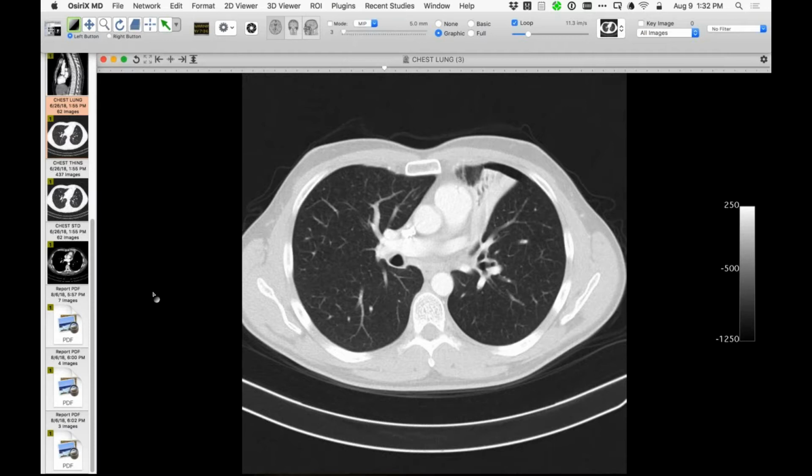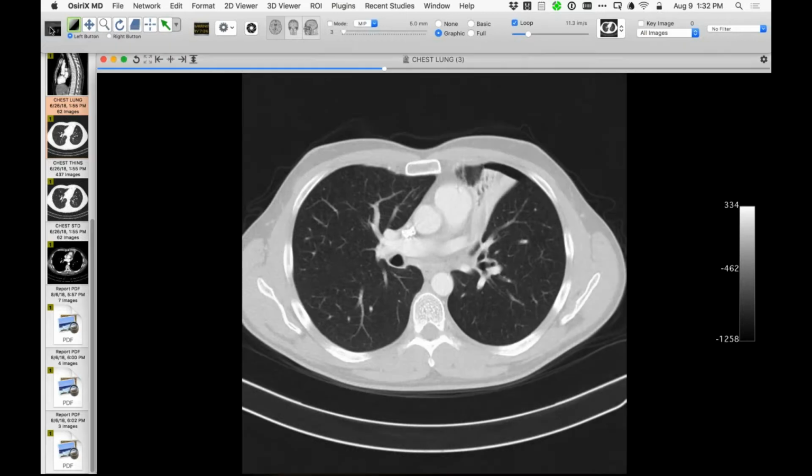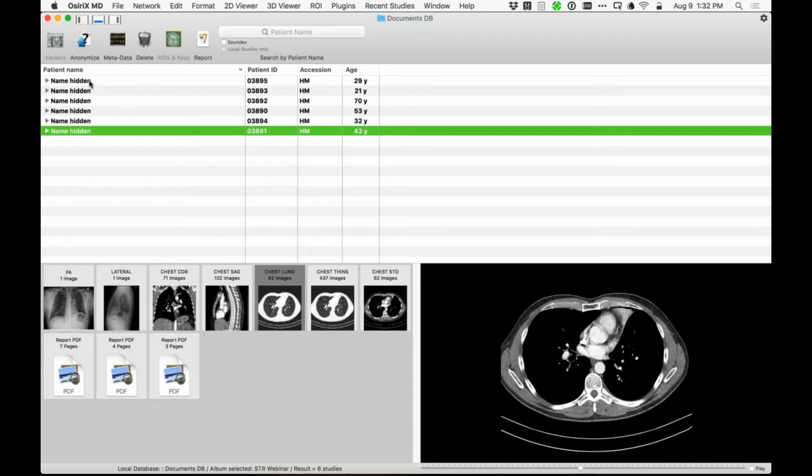It's not as if it formed because the lung collapsed and sucked the gas there. It's because you introduced it when you drained the effusion, and it's not going to go away, because unless that space refills with liquid, there's going to be gas there. I think that the mechanism is different. I don't think it's appropriate to use ex vacuo for that as well. Okay, good. I agree. Yeah, it's a different thing.